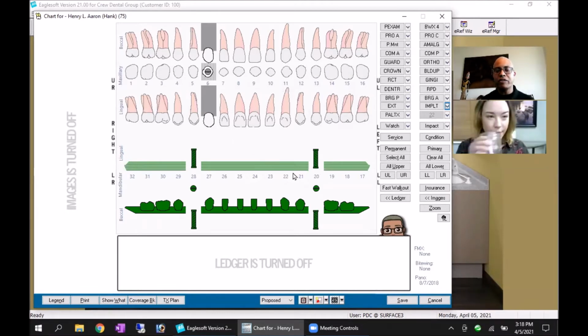So yeah, if you just sequence it this way, and I know it doesn't look necessarily correct, but if you sequence it this way, you're going to wind up being able to see things a little bit better. Now, when it comes to adding things like your custom abutments and your locators and things like that, that's when we want to talk about things like custom draw types.